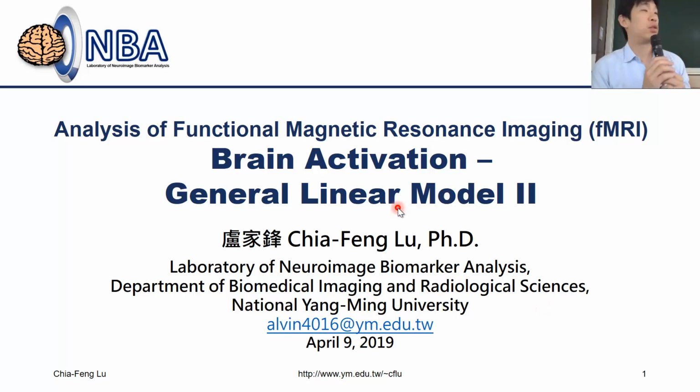This week, I'm going to continue the topic of the general linear model from last week. Last week, we already showed you how to perform the so-called first level GLM analysis using SPM 12. This week, I'd like to give you two sections. In the first section, I would like to extend the usage of the first level. In the second section, I'd like to go into the topic of the second level, that means the group-wise analysis, again using the SPM GLM model, but now the so-called second level analysis.